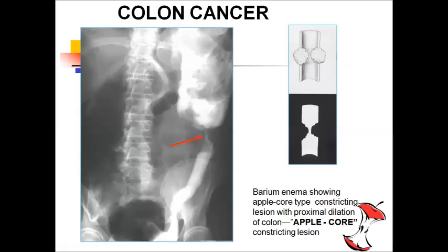Colon cancer. Next challenging problem, radiological methods of examination are combination of X-ray and CT, and both these techniques show us so-called apple core symptom.